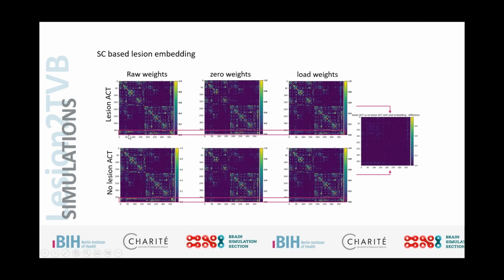And we see the largest difference here in the subcortical areas down here. If we do not perform any specific integration, if we set them to 0, and if we update the weights based on the actual lesion load, this is even after integrating the lesion into the ACT processing. If we do not perform the ACT processing, we see a similar pattern.